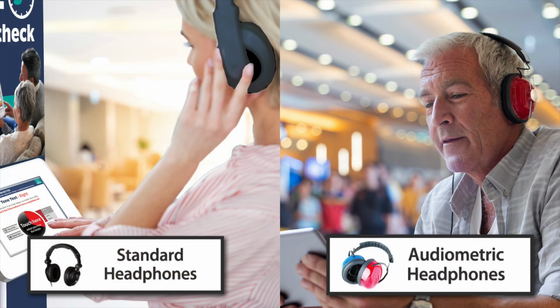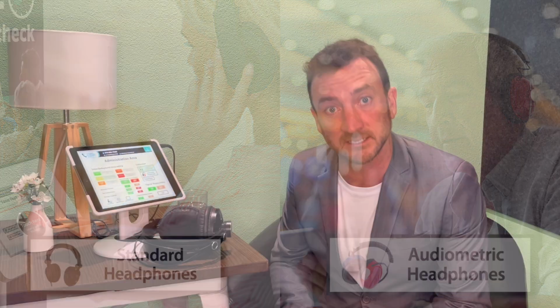One other thing to consider is what type of headphones you want to use. Now, standard studio headphones are good for most situations. However, if you're doing a lot of trade shows and expos in very noisy environments, using audiometric headphones with occluding cups will give the user a greater sense of efficacy in the test, because there will be less distracting background noise. However, the audiometric headphones come in around $900, while a standard headphone is about $100. So it's really up for you to choose that.